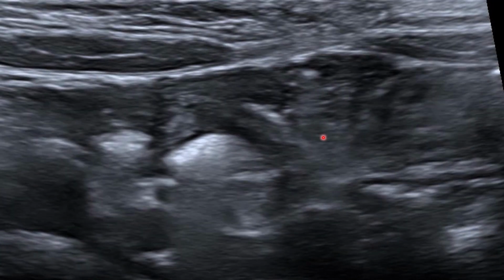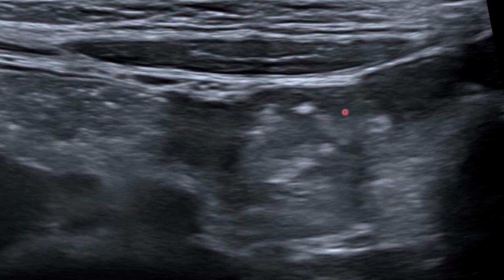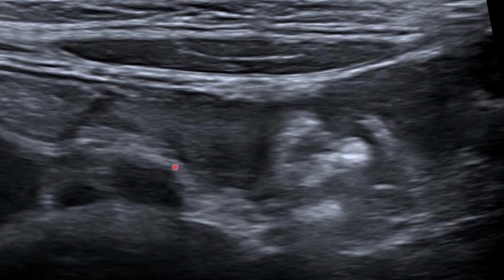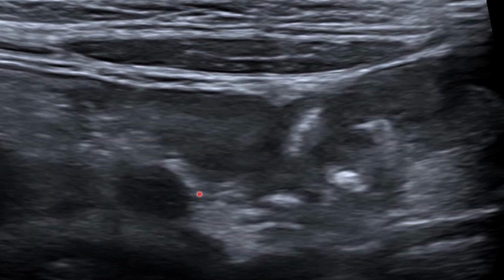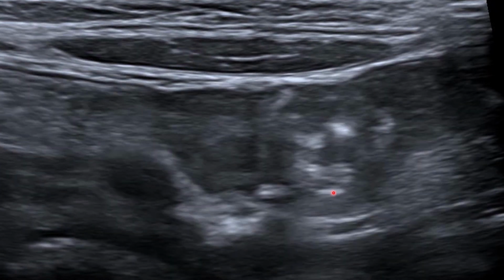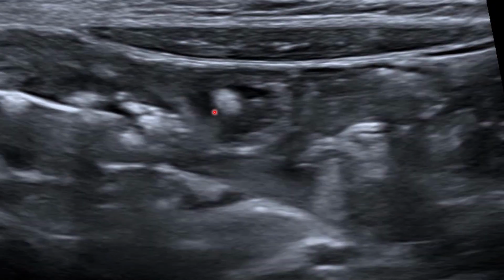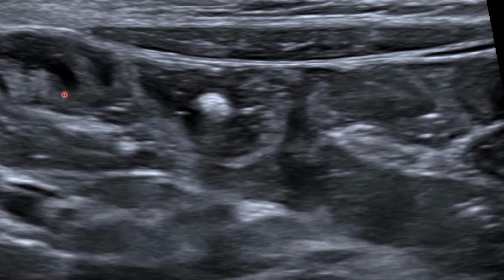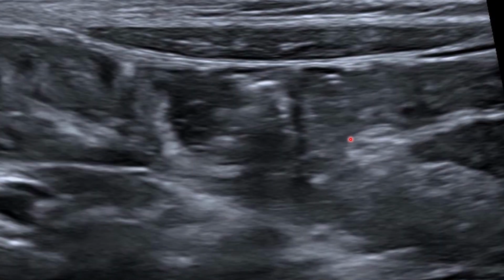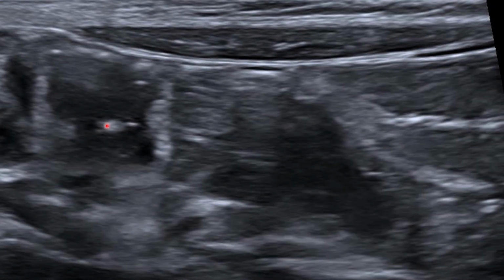So the problem of bowel ultrasound is most people don't have machines which are so good, so it is very easy for you to miss bowel pathologies. So you need a high-end machine that can actually see nicely the whole spectrum of the bowels.